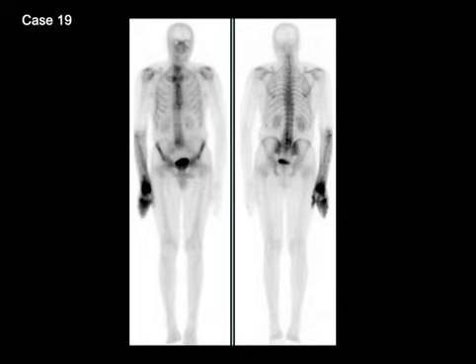Case number 19 shows another artifact on a whole body bone scan where this patient was accidentally injected in the artery of the right antecubital fossa. So this is the site of injection. Instead of injecting into the vein, the technologist injected them into the artery. We waited for 3 hours. We did the whole body scan. Most of the activity has returned into the systemic circulation and is seen taken up by the bones, but there is still a large amount of activity seen in the soft tissues of the right distal upper extremity from accidental arterial injection of the tracer.